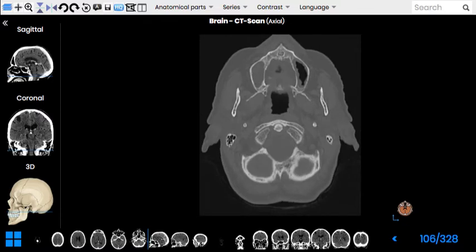Well, let's go further downward, and you can see another bone which is just here in the middle, and this is the dens of the axis, the second cervical vertebra. You can see tiny grayish lines of articulation between the dens and the anterior arch of the atlas, the atlantoaxial articulation, the medial one, and tiny grayish lines between the condyles of the occipital bone and the lateral masses right here, the atlanto-occipital articulation. So these grayish lines show us how stable the craniocervical articulation is.